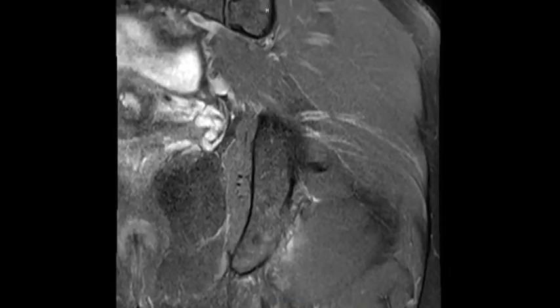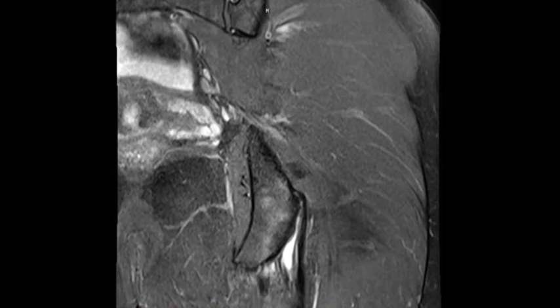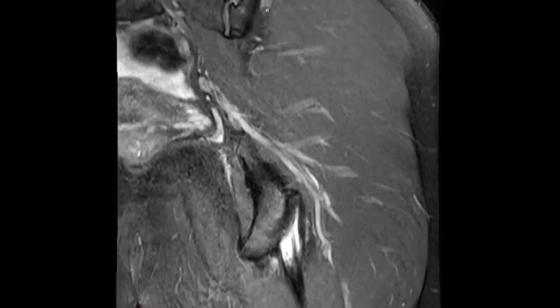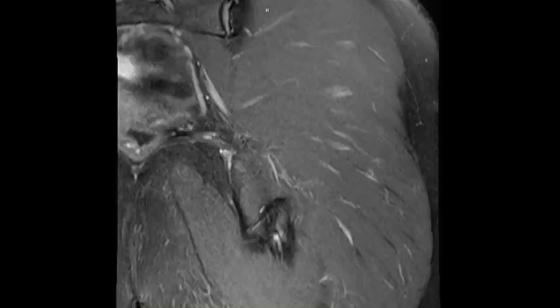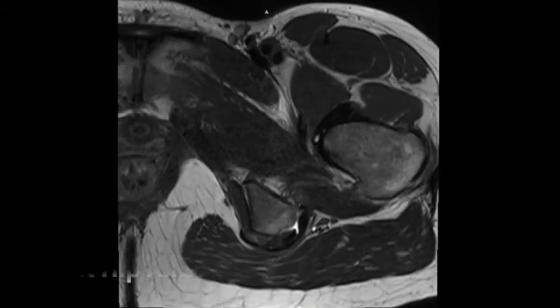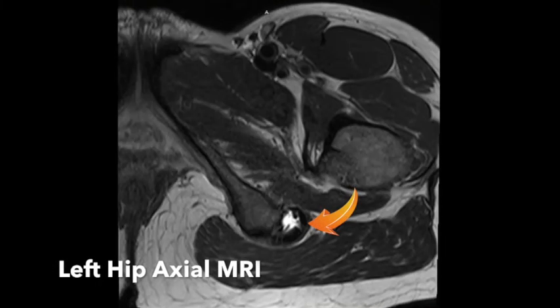Here, the PD-TSE-FS coronal MRI of a female runner with FAI as well as severe hamstring tendinopathy is shown. This finding is also demonstrated on this T2-TSE axial MRI in the same patient.